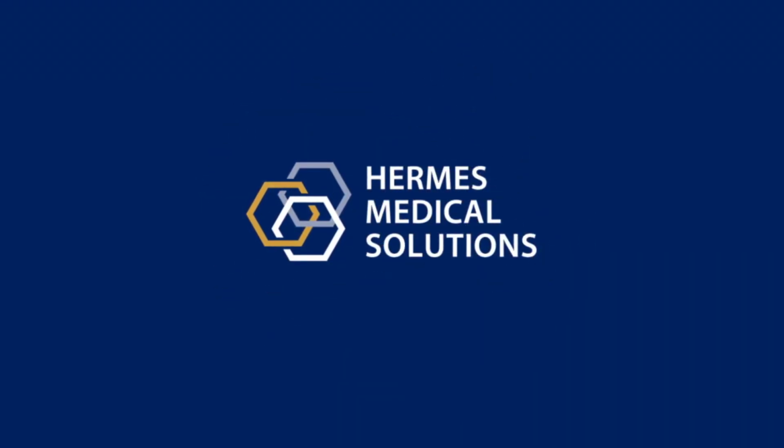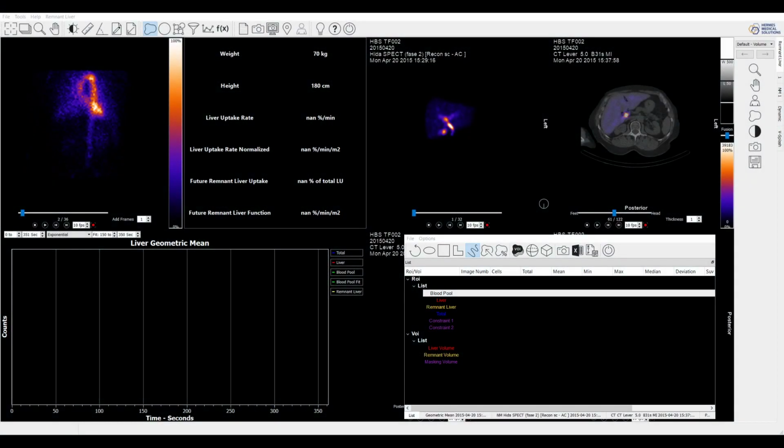Welcome to a brief demonstration of the Hermes Medical Solutions liver remnant analysis tool. The purpose of the application is to predict the post-operative liver function which a patient undergoing liver resection surgery will expect. So we can see we've got loaded here a dynamic HIDA scan.